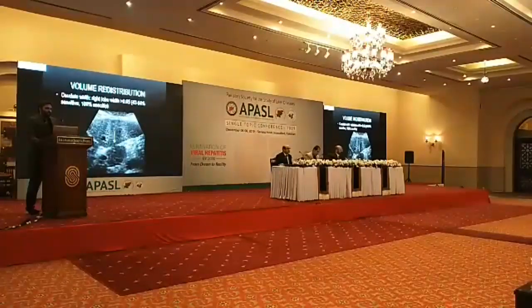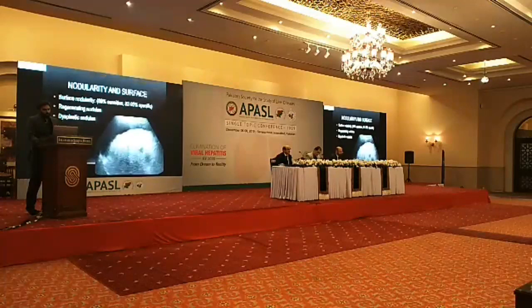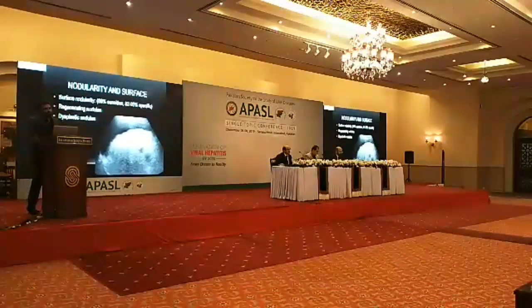Freeze. One is the caudate width to right lobe width ratio, and this is pretty specific. Now, nodularity: it is very important for the sonologist, the radiologist, to see the surface of the liver.